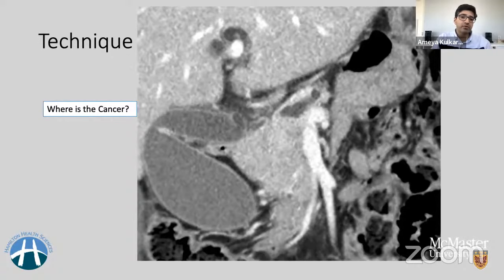When you're starting to do these CT scans, remember that you have your protocols really critically assessed, because you don't want to be doing a wrong examination technique and saying that I don't see the tumor. For example, this is a coronal portal venous phase CT. You definitely see that the gallbladder is distended here. And then you also see that the pancreatic duct shows abrupt cutoff of the dilated duct. So there has to be something going on here.